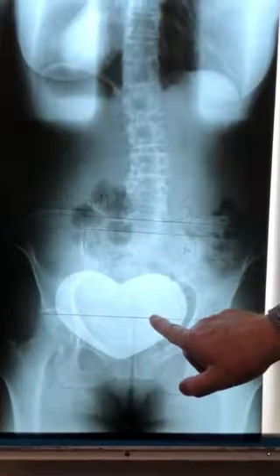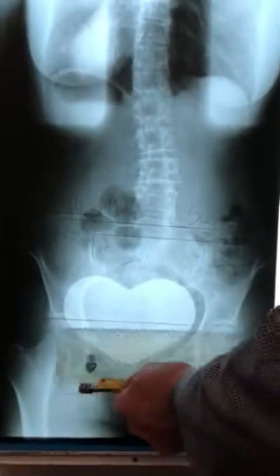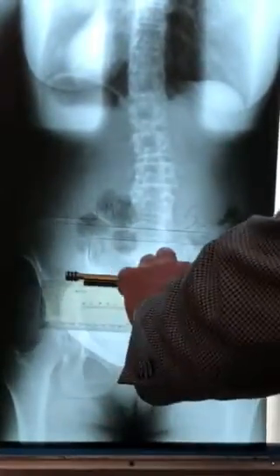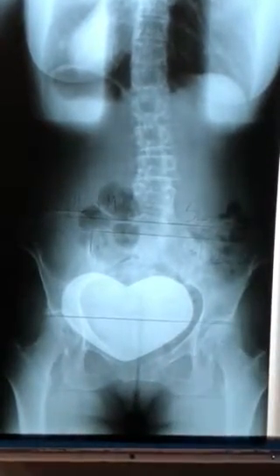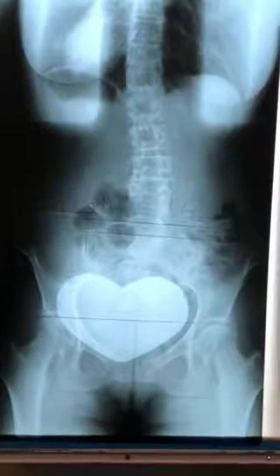Now the two purposes of the femur head line are, number one, it's our reference line as we draw our lines with our parallel to draw all the other lines on. We'll draw the lines through the ischium, both sides, and so forth. And the other is that we can use the femur head line to help us determine the short leg. For this exam, we're asking you to point to the femur head line. That'll give you 3 points.